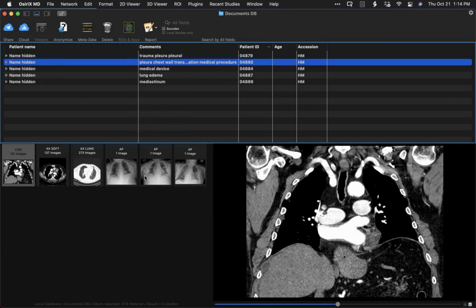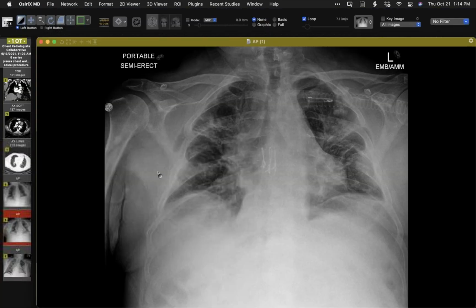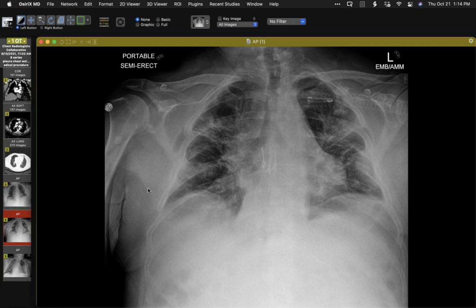This one is just a little bit of a curiosity, nothing too special. This is just a situation after lung transplantation. I don't know the etiology of these opacities. I think they're areas just of atelectatic or scarred lung. But what is a little bit interesting is the fact that we can see a bit of air right here in the chest wall, and a similar finding on the other side, but in exactly the same place in the chest wall. So there is a little protrusion of lung, transcostal herniation of lung into the chest wall.